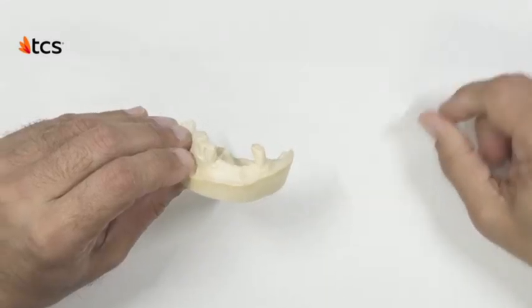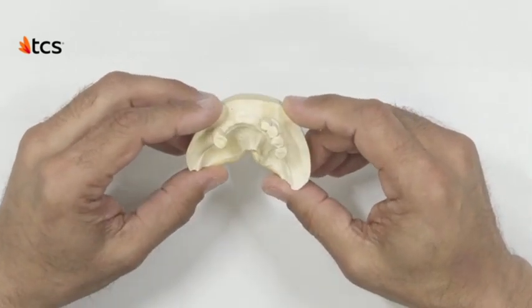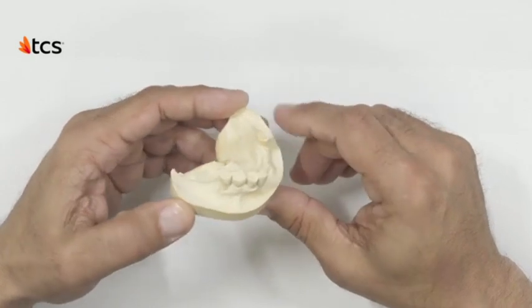To Design Demo 6. We will begin by assessing the design plan and amount of undercut needed for this case. These two end saddles mark the difficulty of this case in terms of path of insertion and retention. On the right side, we can see a lack of retentive opportunity. The absence of abutments will require the use of tissue for retention.